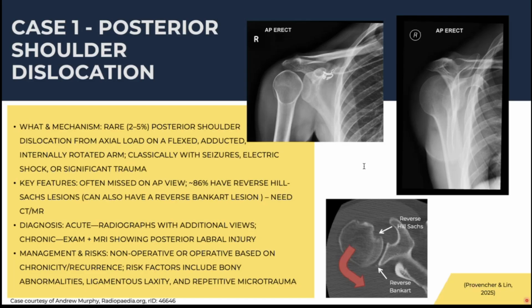I don't know if you want to talk about this, Dr. Hussain, with the dislocations. Yeah, completely agree, Abigail. The anterior dislocations are the ones that we see more commonly. And if we look at the image at the bottom, I think I might take control actually, if that's okay.